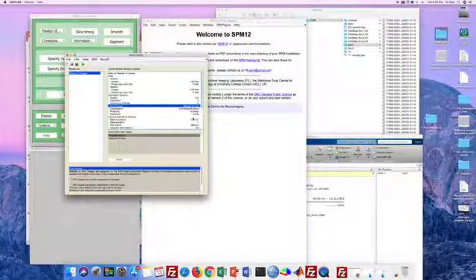And in our sequence, we collect T1 first, and then we collect two runs of EPI images. So the first image of the first run is the closest image, just right after we collect T1. So we use this one as the reference, meaning the movement between T1 and the first EPI image is the minimum across the time series.